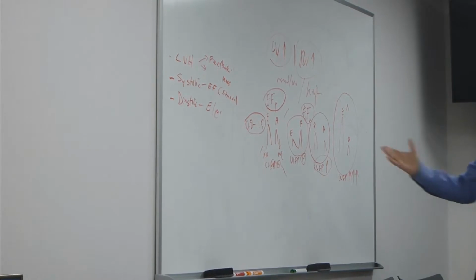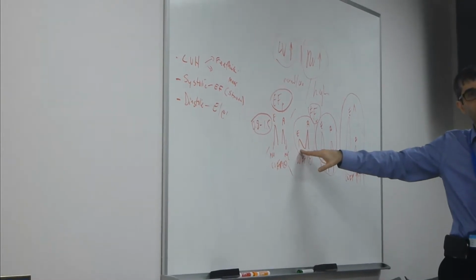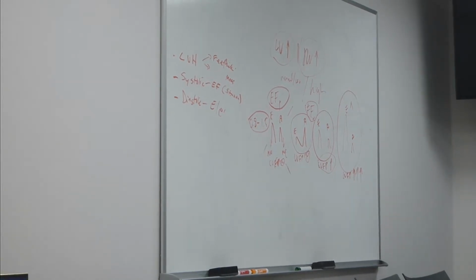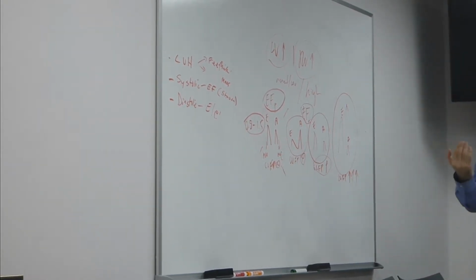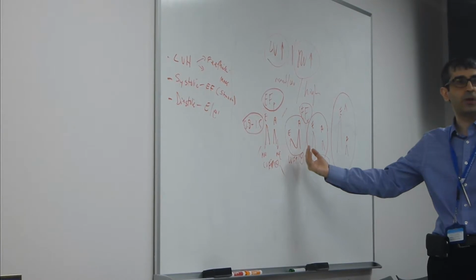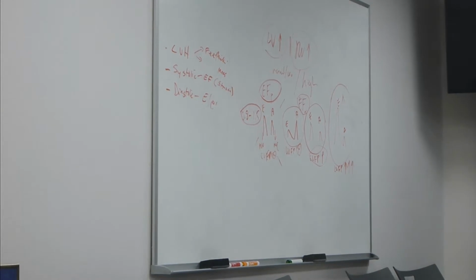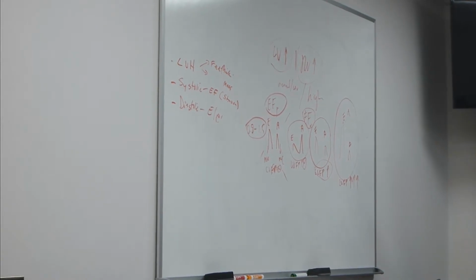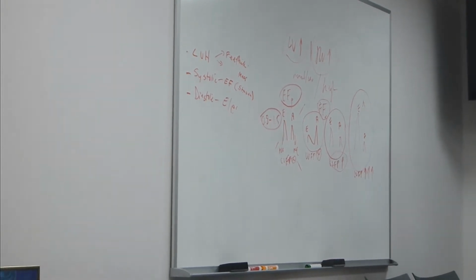On the other hand, in older people, after the age of, let's say, 65 to 75, the relaxation filling pattern becomes normal because your ventricle loses elasticity as you get older. This is how the aged ventricle looks when they get older. So in these cases, that's when your tissue Doppler becomes important, because most of the time, with the tissue Doppler, you can get a sense of where you stand on the filling pressure. Not in isolation, but it's very helpful.